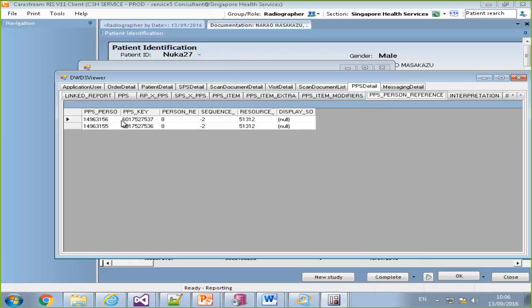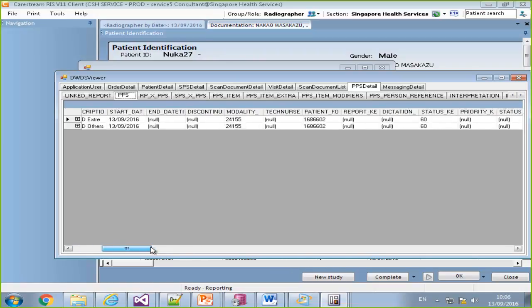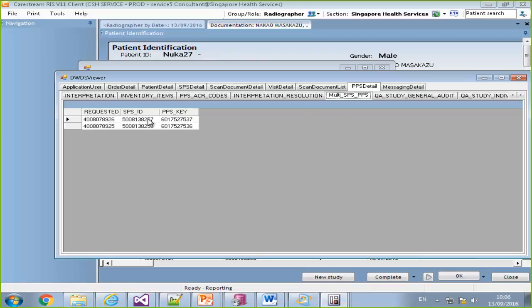Okay, both of them had, and we have the PPS that we created before, and those tables that I showed you, the multi-SPS PPS. So. Okay, it has those PPSs, and that's the thing.